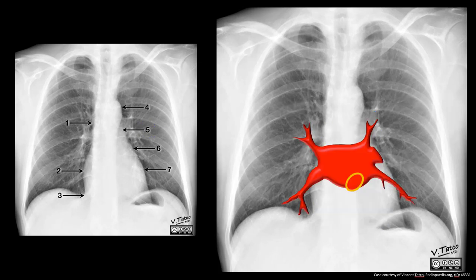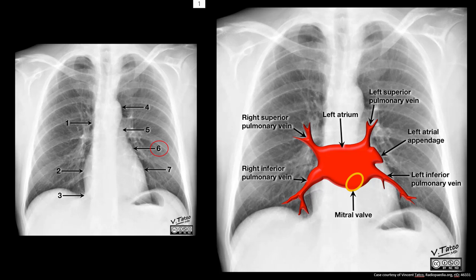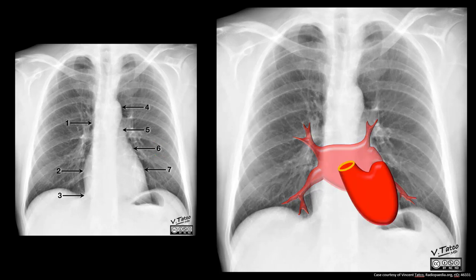Now returning blood from the lungs that's been freshly oxygenated comes into the left atrium, which we can see takes the entire expanse of the posterior aspect of the heart, and then exiting that left atrium down through the location of the mitral valve. We're not really going to see the mitral valve from this perspective, that's just the location where it's at. Now we've entered into the left ventricle. We can see the contour of the left ventricle over on that right side, indicated number 7.